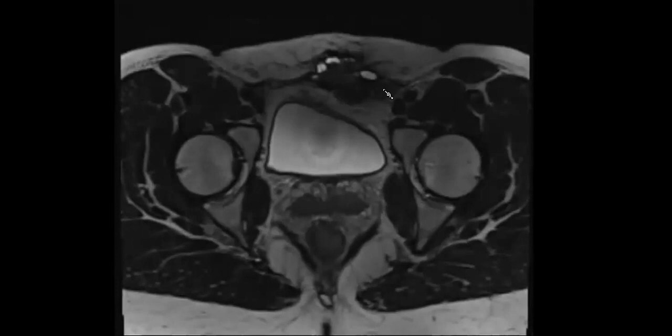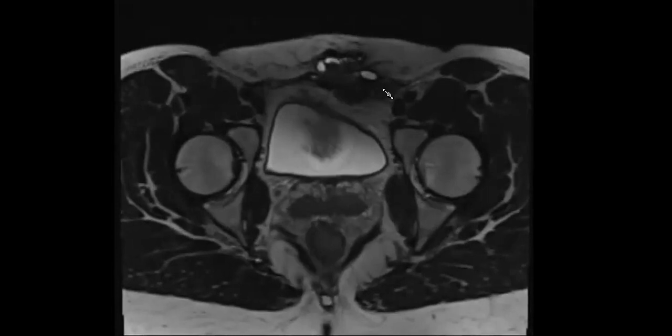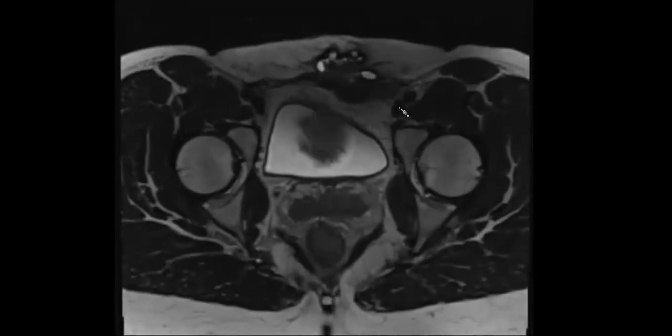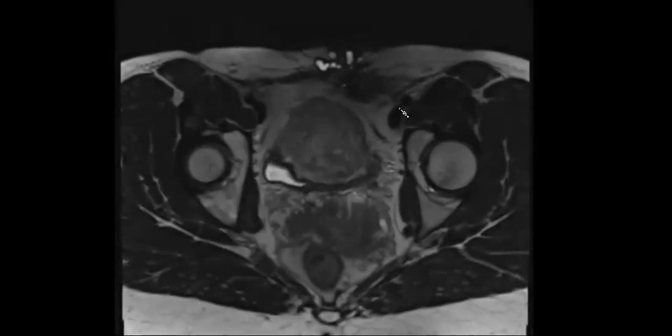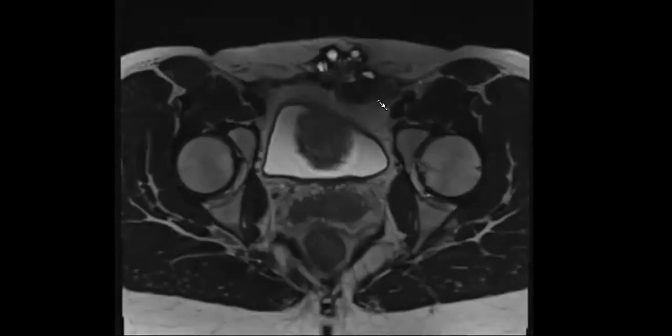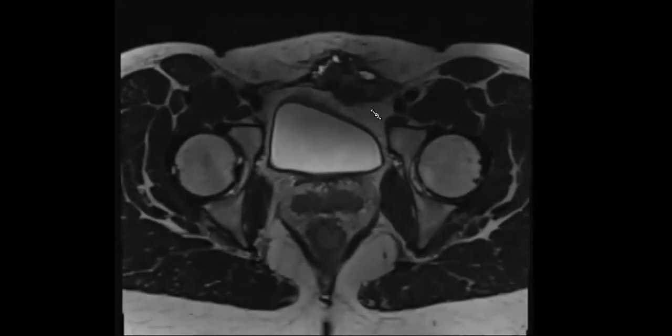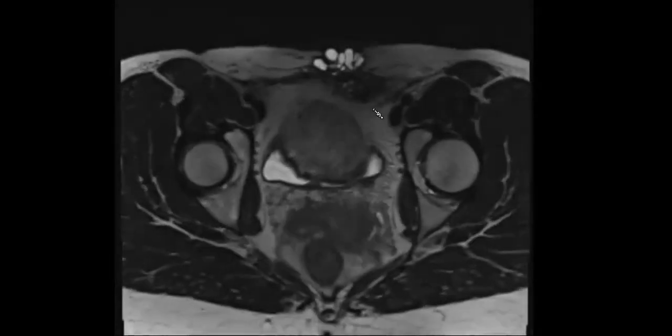Like prior C-section, scar issues. Yeah, so the other, but not with this appearance. Not with this appearance, yeah. But the other major thing to think about is fibromatosis or desmoid. Yeah, so especially in a patient who has a history of FAP or Gardner's. But like Victoria said, this looks much more like a scar endometrioma. It's actually the biggest one I've seen, this kind of beautiful one.